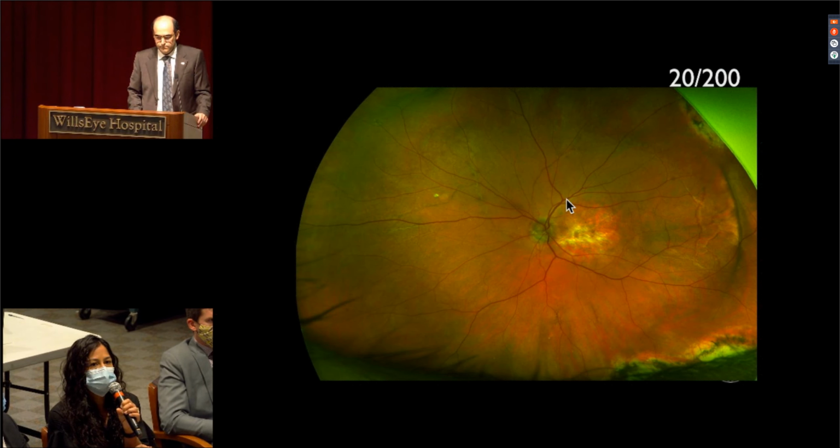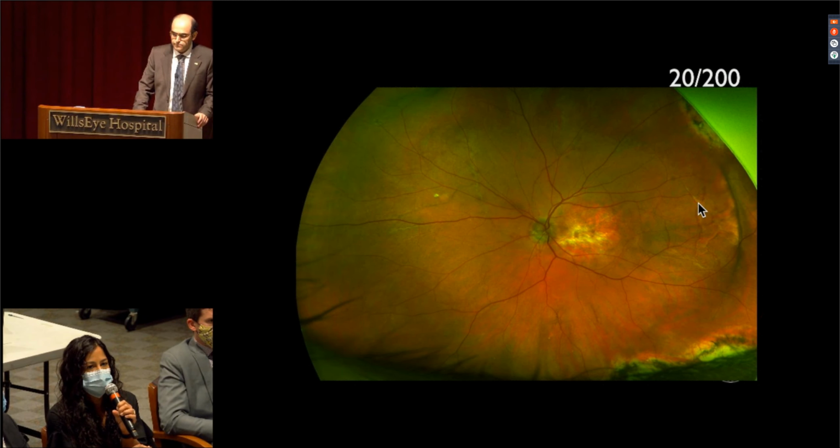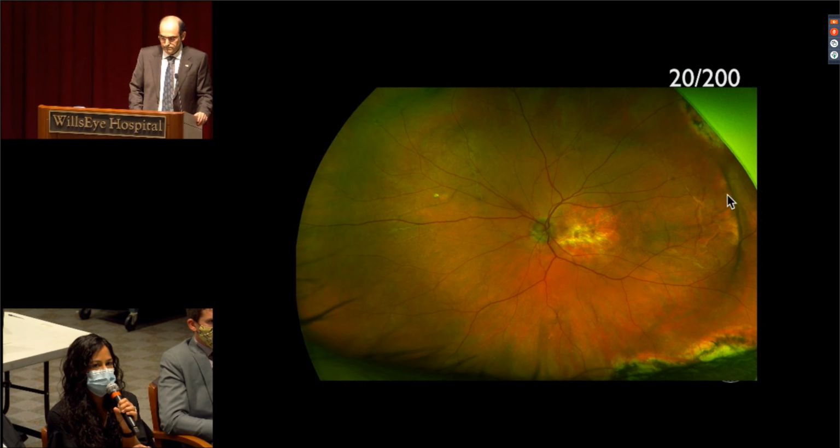And then going back to the periphery, temporally, similar to the other eye, we see a jagged linear, streak-like lesion here. And then actually here, surgical history is important, but this almost looks like the ridge of a scleral buckle. You can see some chorioretinal scars supratemporally, possibly a cryo or laser scar. Similar findings here and inferotemporally as well.